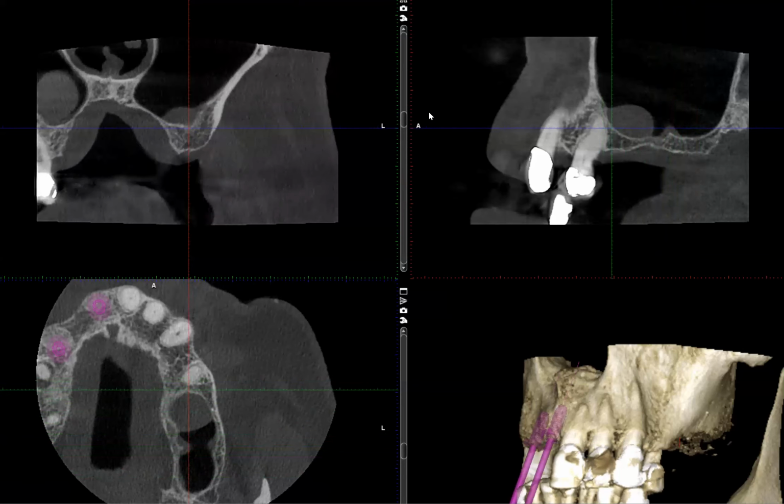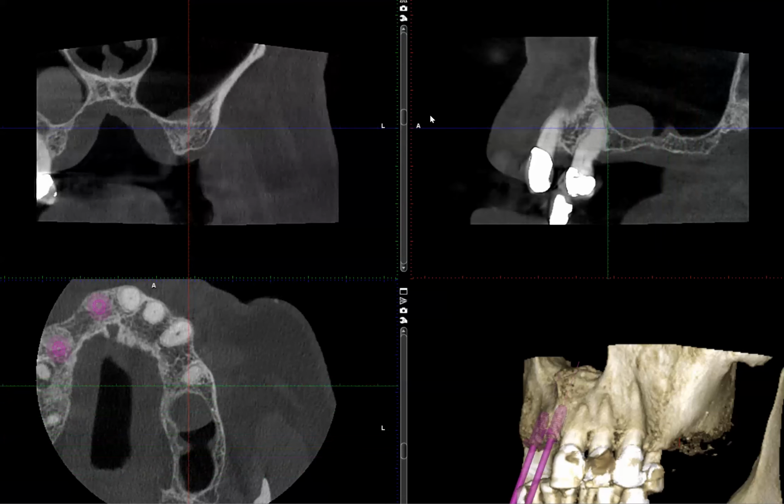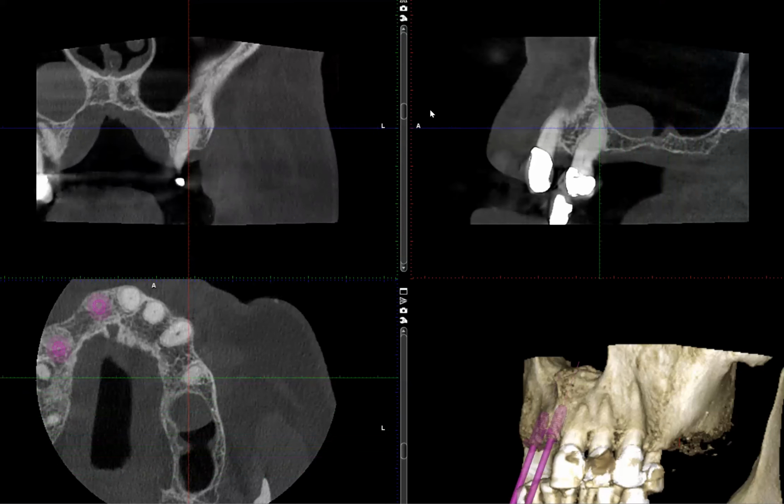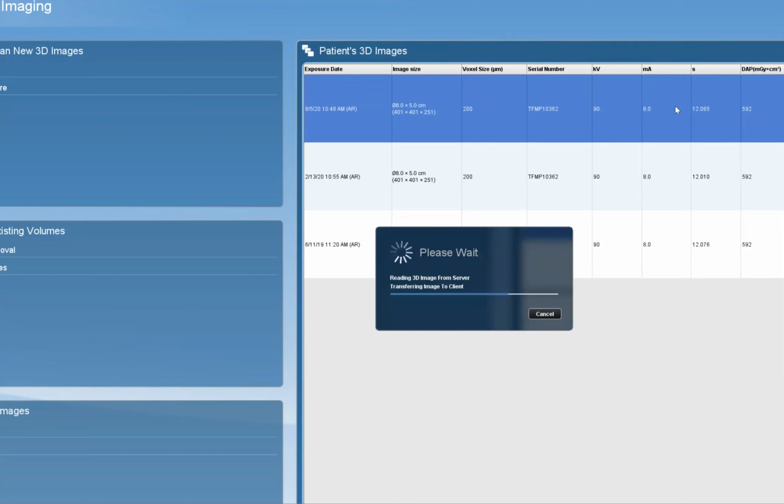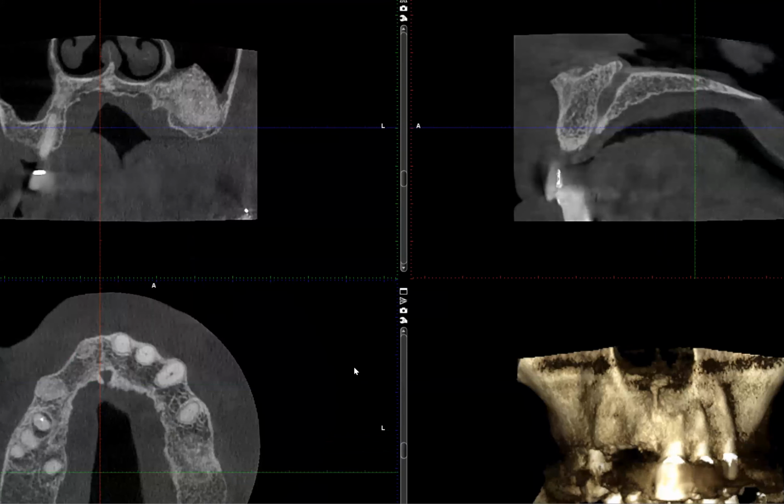So our resident completed a direct sinus lift procedure, and I want to show you a scan that is taken about 5 to 6 months later from this one. So here we go. We actually took the patient's right maxilla as well because this patient is planned for some other implants in the anterior maxilla.